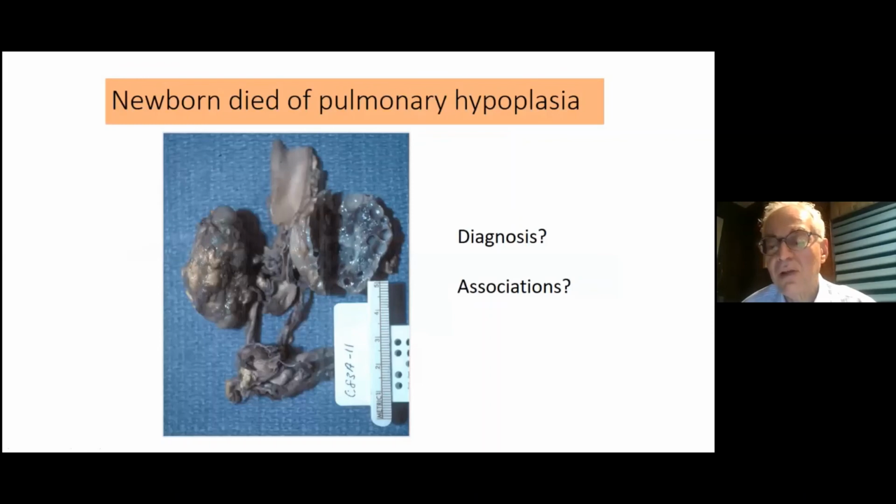Okay, in the last 2 minutes, let me give you these couple. This is a newborn who died from pulmonary hypoplasia. This is the pathology on that one. You can see these things here. It could be bilateral multicystic dysplastic. Yes, it was Potter syndrome, true. But polycystic kidney disease, can you tell me what type? What type of polycystic kidney disease?